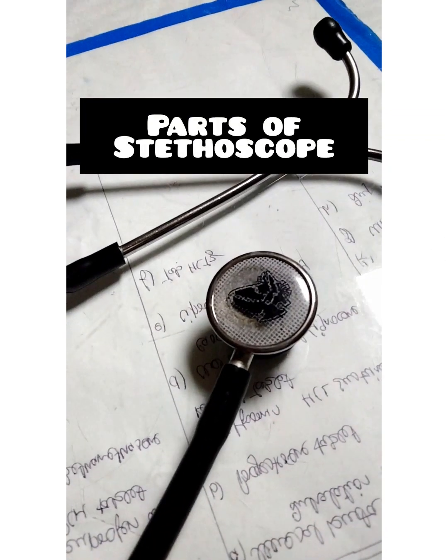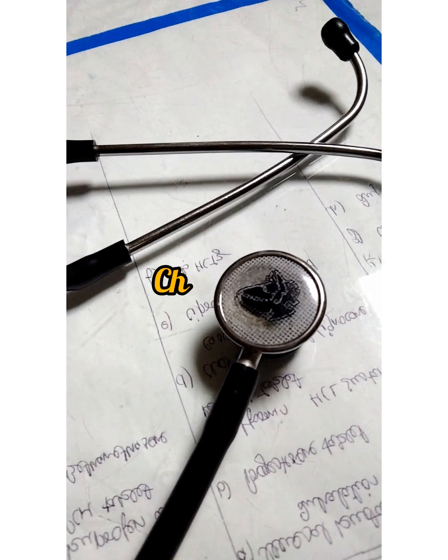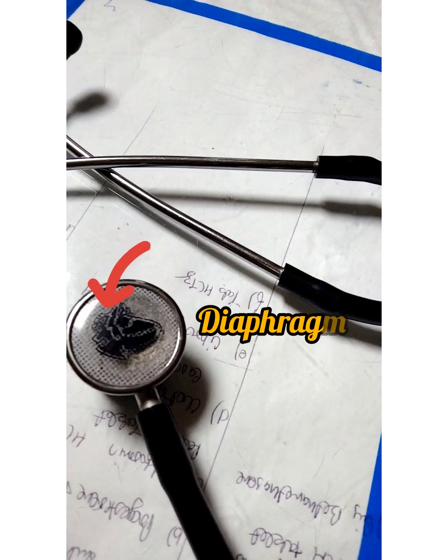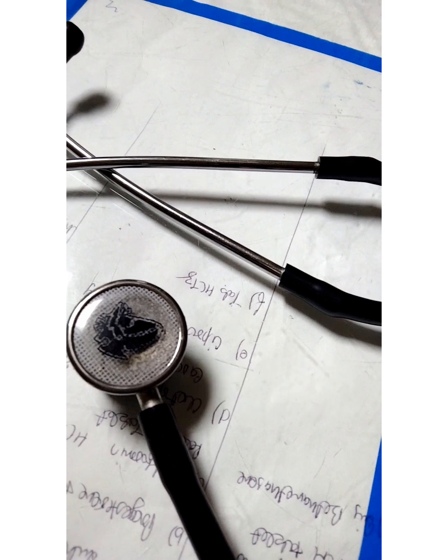Second thing is parts of stethoscope. The circular part is known as chest piece, which is used for the auscultation of the sounds. Chest piece having bigger diameter is known as diaphragm. It is used for listening high frequency sounds like apical pulse and respiratory sounds.